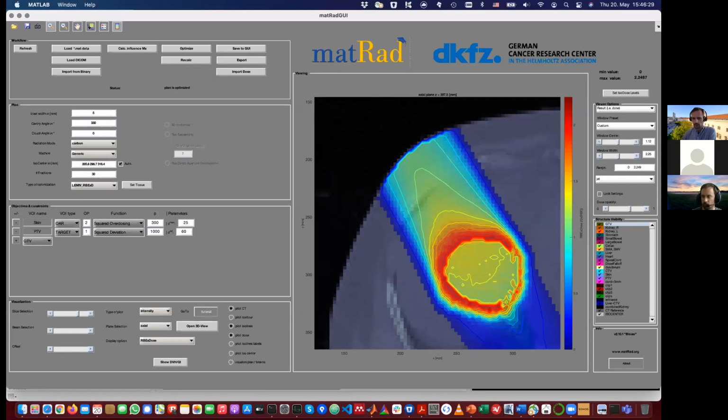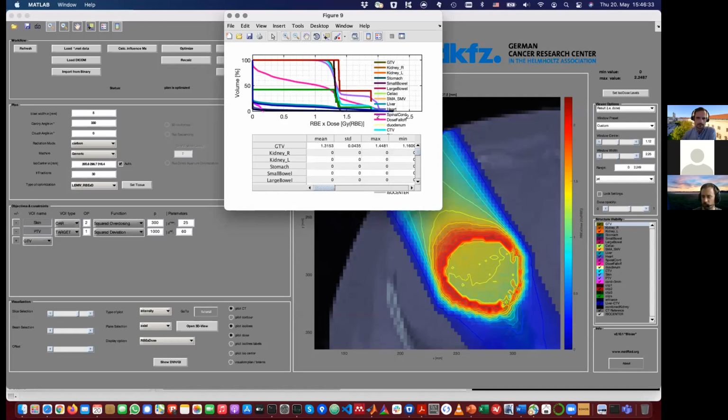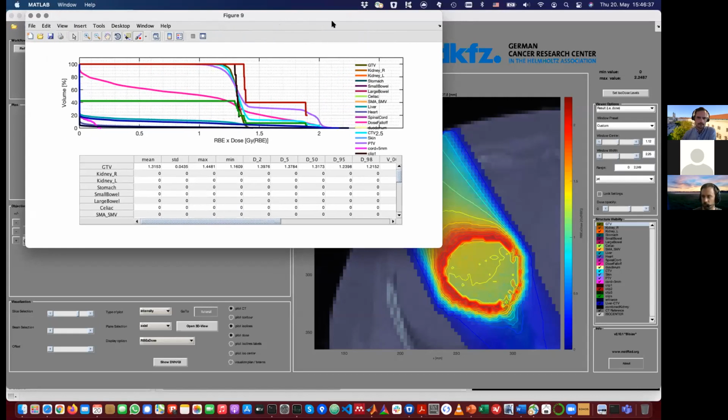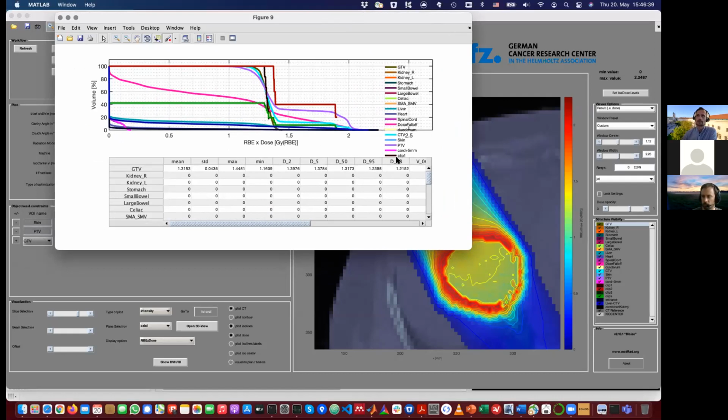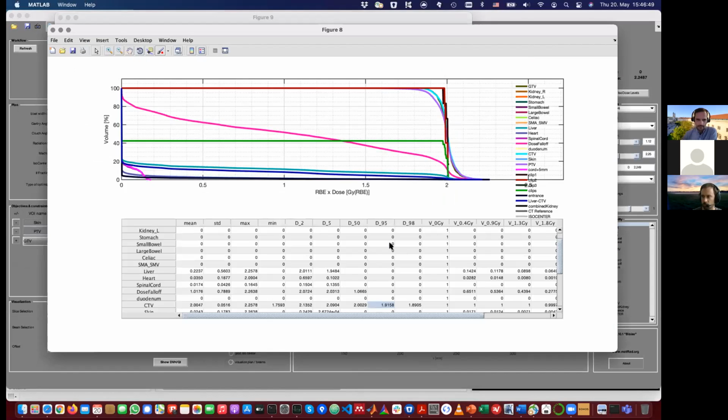And now we should also see in the DVH, when we look at the turquoise line, that because we changed our reference tissue, the radiation became less effective, and we now heavily underdose our CTV. And I'll just put up the previous DVH.